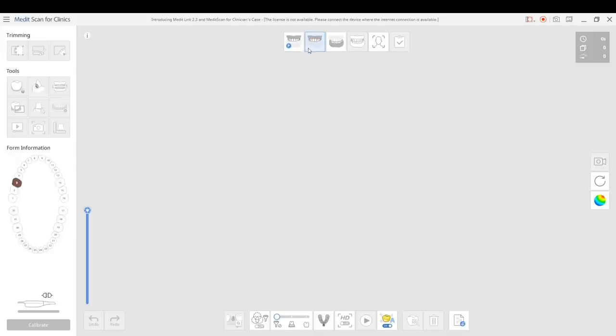So we've got the upper jaw, pre-op, lower upper jaw, where the prep goes usually, and then we have the lower jaw scan and then the bite, and you'll see more demonstrations of all of these. And this was just barely introducing you to some of the functionality available to you in the new scan, and how it impacts the clinical decisions you make, and how it speeds things along and lets you capture information very quickly and readily so you can process a case.